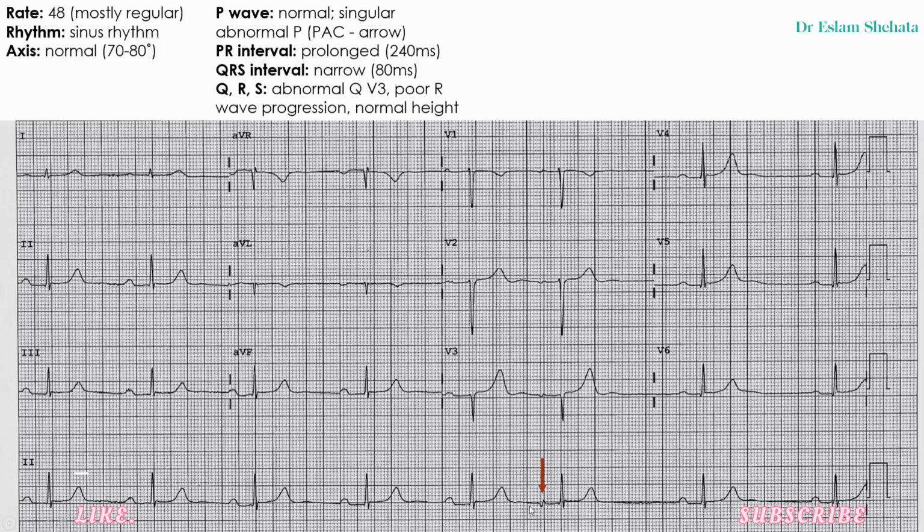Okay, so this is a premature atrial contraction, or PAC. Alright, an ectopic beat. Now we'll talk more about those in a different lecture, but there's an example of an atrial ectopic beat. Otherwise, the PR interval is prolonged, so it's longer than one big square. You can see that quite clearly here. The P wave starts basically on that heavy line there, and the QRS complex takes more than one big square to begin. Okay, so a prolonged PR interval.